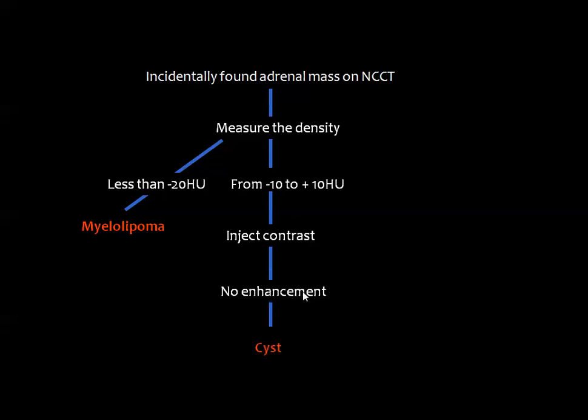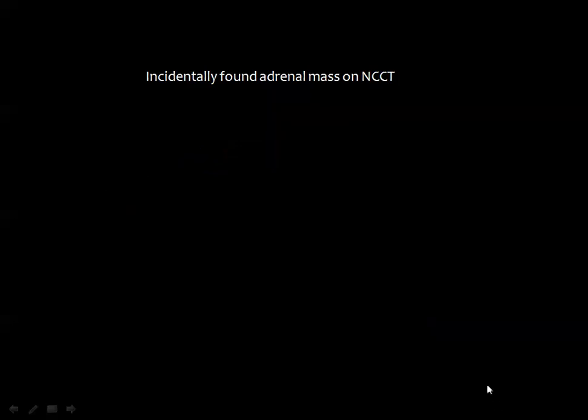If there is no enhancement, then you are dealing with a cyst in the suprarenal gland. But if there is enhancement and not only enhancement, but with washout of more than 60% of enhancement in the delayed 10-minute scan, then you consider lipid-rich adenoma.